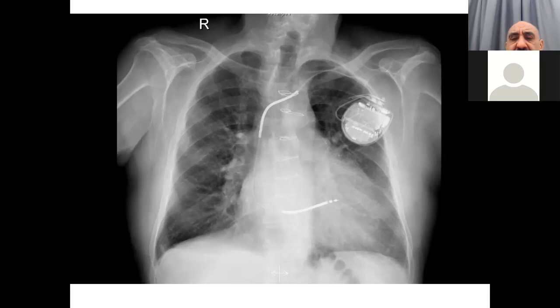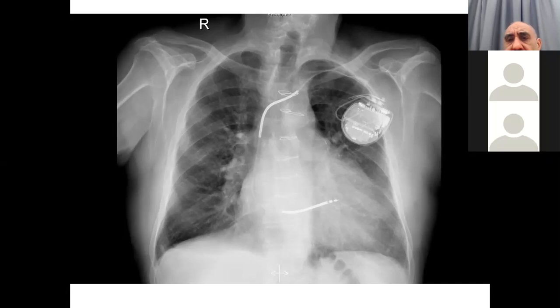And this patient underwent a catheter procedure by TAVI. This gentleman, who's 90 years old, had prior coronary artery bypass graft surgery in 2004, and he underwent a defibrillator in 2008, and he underwent a TAVI prosthesis in 2012.